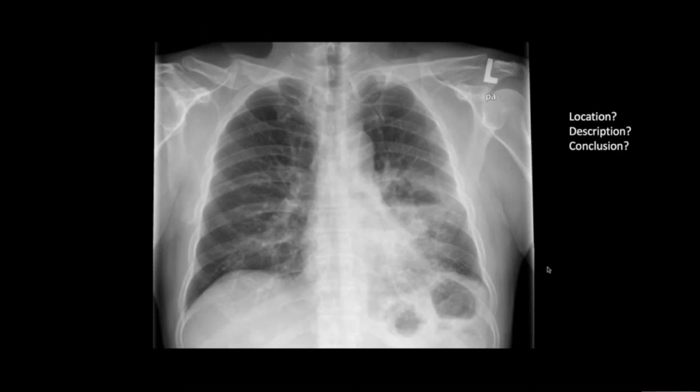In this radiograph, the abnormality is in the left lung. If you look carefully, you can see a lucent area with gas fluid level consistent with lung cavitation. There is surrounding consolidation. Differentials of solitary cavitation are infection and malignancy.